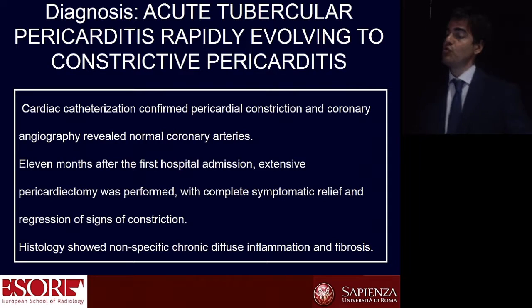So, just to show you, we focus on the mass, and this patient with tubercular disease progressed to pericarditis, and we did the diagnosis with MR. Colleagues didn't have a clue on what was going on.